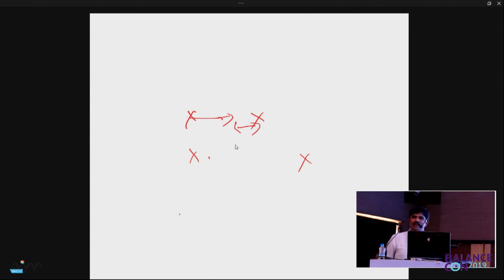So when you see the next one, the second picture after hypometria in this page, Balance Con 2019 Mysore, look at the left eye graph versus the right eye graph. The left eye seems to reach its position in one go, ballistically. Is that right? Is the right eye reaching its final position in one go? It is not. It is stopping short of it. Afterwards, it is using a slow movement to reach the final position.